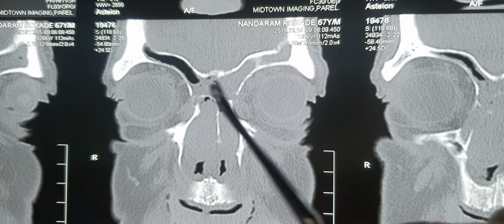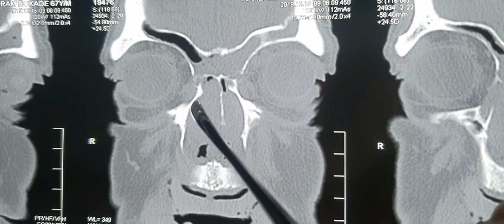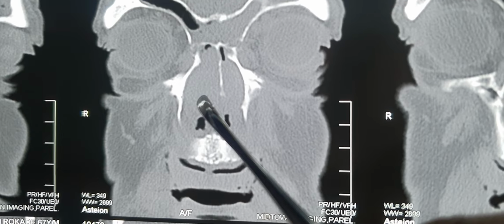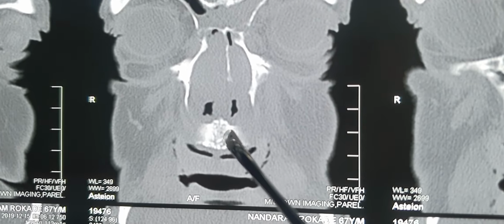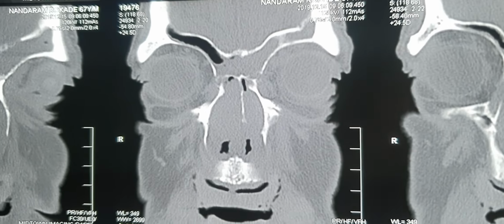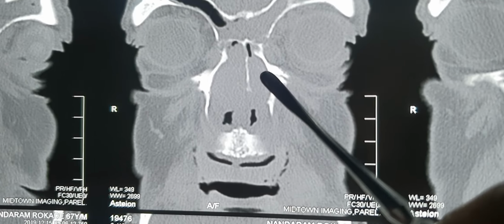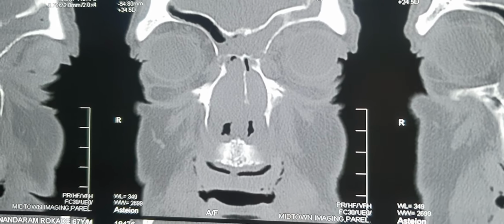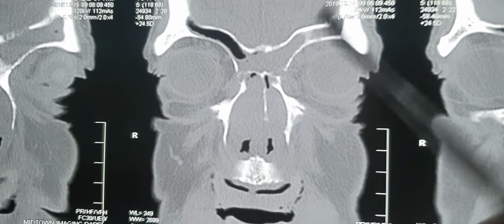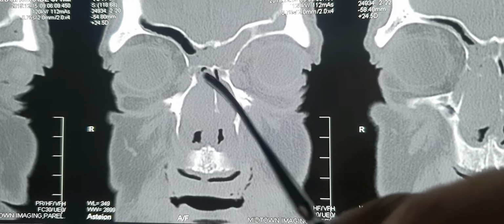So this is still the area of the frontal sinus, the perpendicular plate of the ethmoid, the nasal septum, the frontal process of the maxilla, the nasal cavity being completely opacified still. This is the appearance of the maxillary bone, the origin of the maxillary crest area over here. So you can see this is all soft tissue opacification, suggesting that there is presence of a nasal mass bilaterally. Now still the frontal beak is intact, so we haven't yet reached the area of the frontal recess.